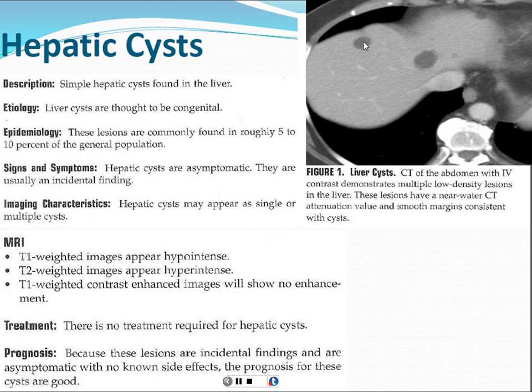As you know, on CT we always measure Hounsfield units when we see something like that. If you get a fluid level attenuation around, say, 10 Hounsfield units or so, you can be pretty satisfied that this is a cyst. You'll see with time, sometimes you'll see that patients had a cyst and it got smaller or got bigger. They can change with time, but usually they keep this benign, very well circumscribed, very dark appearance. And on MRI, it'll be similarly homogeneous, dark on T1 and bright on T2, just like all fluid is.